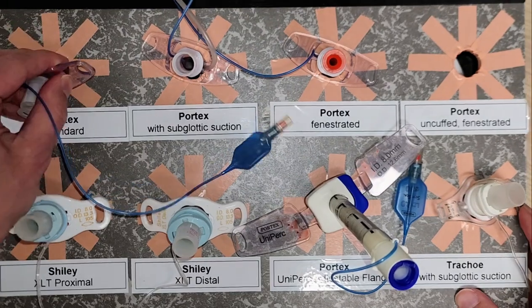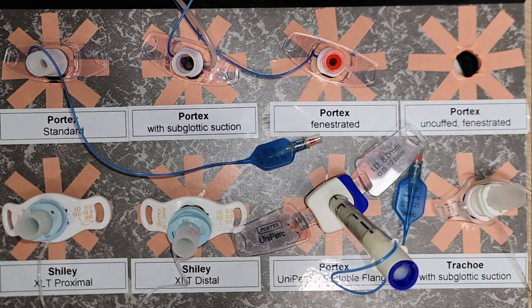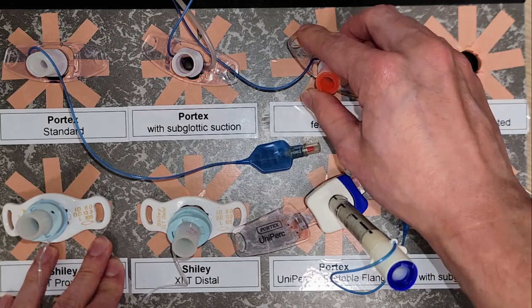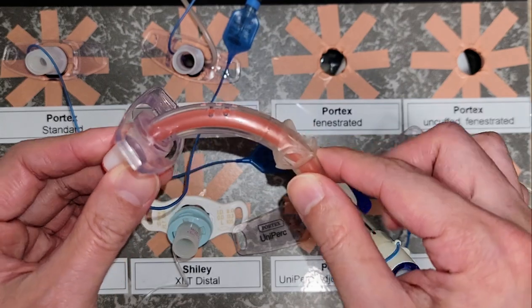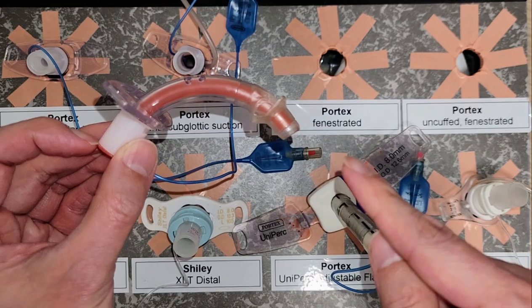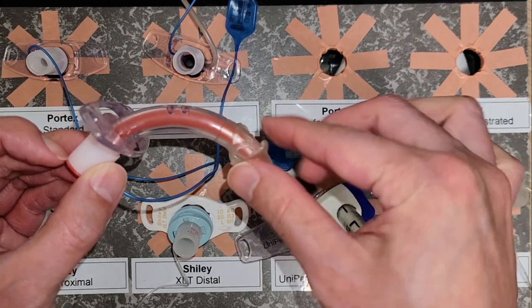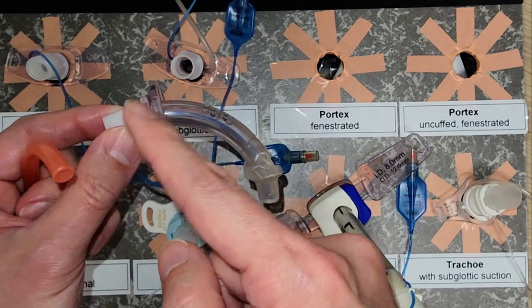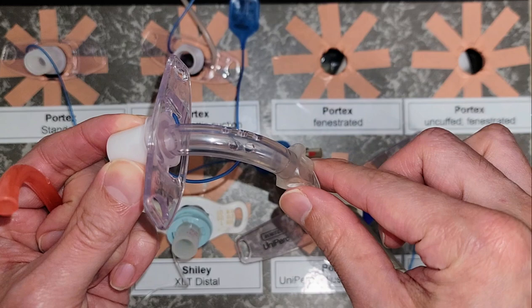As we can see on the board, there are many variations of the tracheostomy tube. Some provide fenestration so that in particular configurations, gas can travel from the lungs up past the tracheostomy tube and past the vocal cords to facilitate speech. In this instance, gas will be passing through both the inner and outer cannula, and as you remove the inner cannula, instead of gas coming out to the atmosphere, it passes through these fenestrations up to the vocal cords.